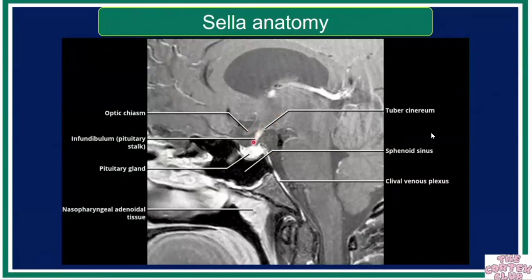This is an enhancing pituitary stalk. This is an enhancing pituitary gland, which on post-contrast images actually enhances homogeneously. There is no distinction between the posterior sellar bright spot and the adenohypophysis on a post-contrast T1 weighted image. And again, in this, we can see that it extends from the hypothalamus to the pituitary gland. More anterior is the optic chiasm. And then posteriorly, we see another bump, which is the mammillary body.